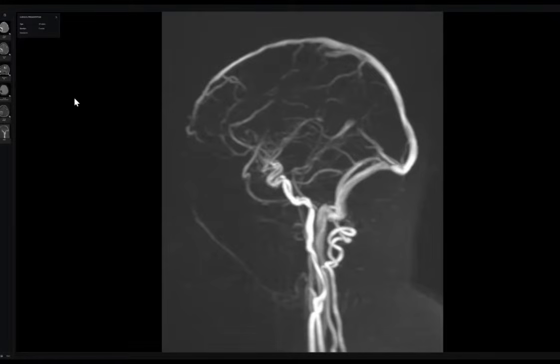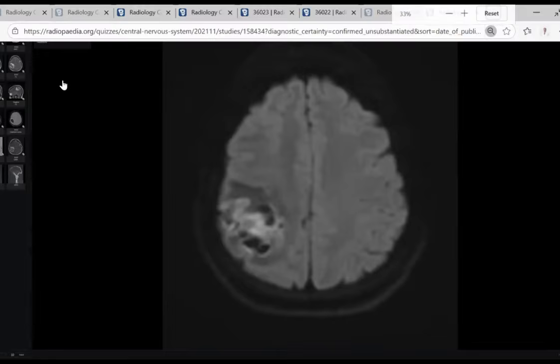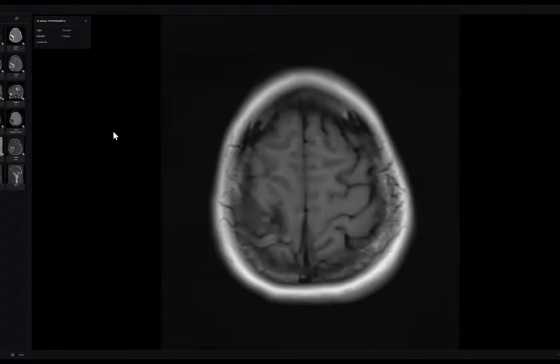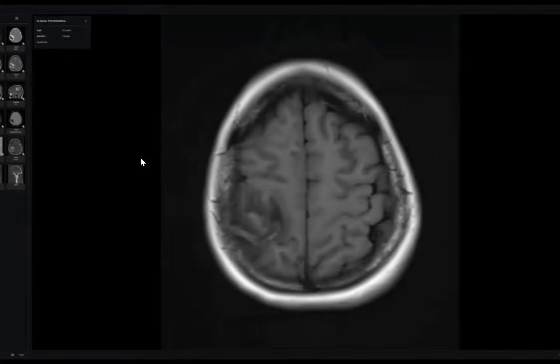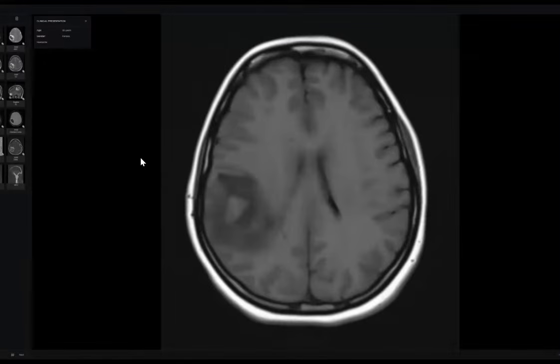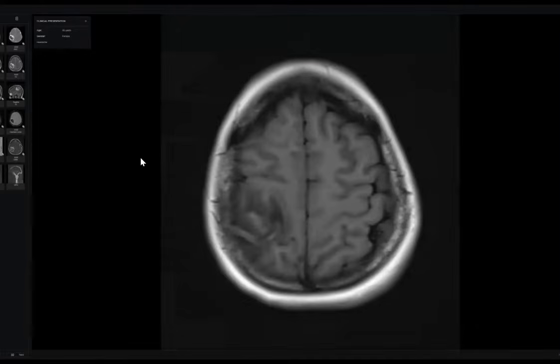Let me help you. In MRI, my colleague, start with the conventional sequences. Very conventional. T1, very important. Look here, my colleague. What is this? There's hyperintensity. Hyperintense in T1. What does it mean? It's like thrombosis. Okay, thrombosed vein.